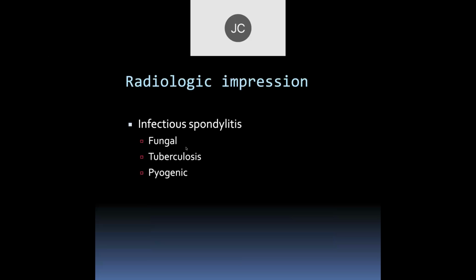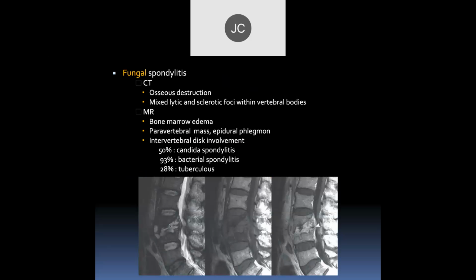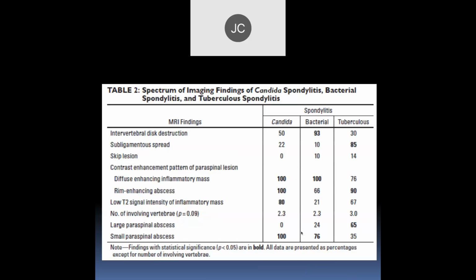I'd be concerned about TB. They were too. They were concerned about fungal. With pyogenic, there's a lot of disease there that'd be much sicker, and this turned out to be Candida. Another fungal disease. The more discombobulated things get, the more likely it's going to be fungal because it's more chronic. These just correlate with symptoms and findings. But the bottom line is you have to get cultures on these.